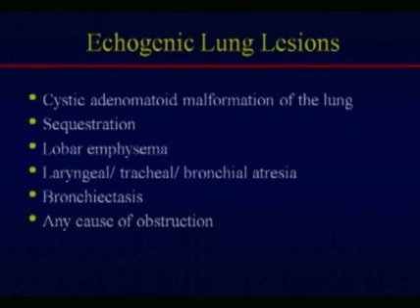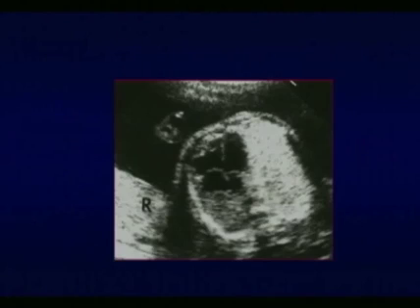Sequestration, which is similar but different, and there's actually overlap with CAM both by imaging and pathologically. And there's also other conditions that can produce echogenic lung lesions, including airway obstruction, really any cause of obstruction.